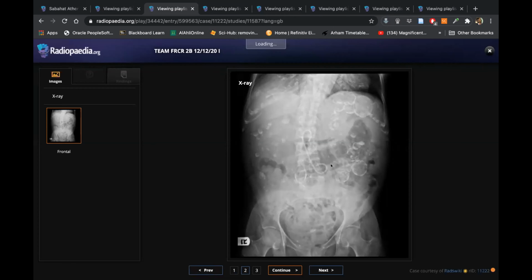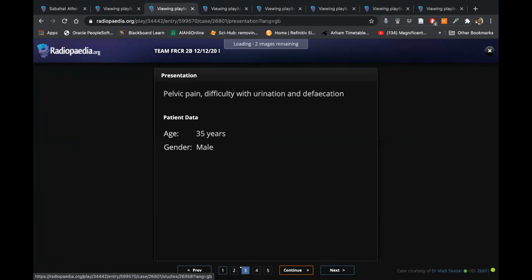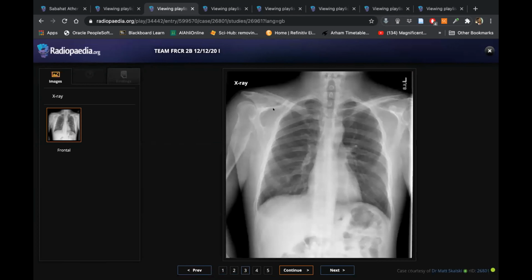But this is actually massively enlarged polycystic kidneys. And the other association which I was trying to find out from you was the intracranial aneurysms. A percentage of polycystic kidney disease can have intracranial aneurysms. Yes. Coming to the last case, look, this one, it was tough, so no issues. You picked up this properly.